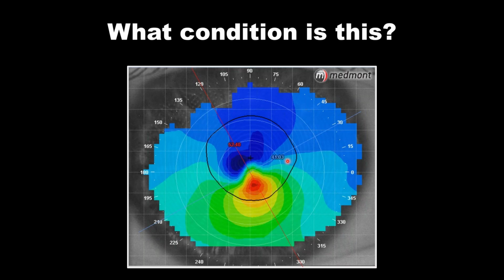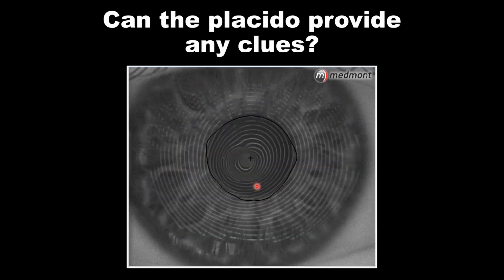And certainly it's looking like we have a true keratoconic patient, but there's a fairly irregular shape to the way the cone goes from steepest here to flattest. It's not very common for the corneal surface to have its steepest point and its flattest point within a millimeter of each other. Normally, corneas flatten at a relatively constant or smooth rate, even in an advanced condition like an advanced keratoconic patient. So are there any clues to understand this case?